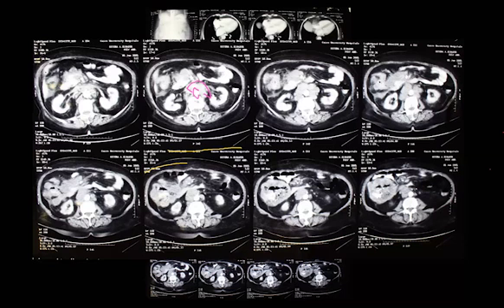What I mean is you first describe them. How do they look? What is their shape? What about their density? What about their homogeneity? What about their location? Maybe before their density and so on, their location. What is their size? These are not cysts. They may be a bit heterogeneous, yes. What are the two structures that appear on the edges and are opacifying on the edges of the lesion? The two circular small lesions that appear. This one and that, yes, absolutely.